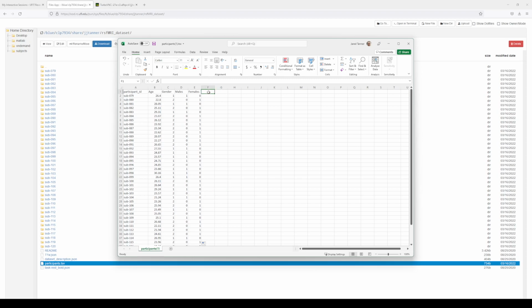What if we want to only look at our male participants or only look at our female participants? So oftentimes I do this, again, so we can look within a group. This would be too small of a sample really to do too much with this, but just to show you this. So then I create two new variables, and we'll do this.